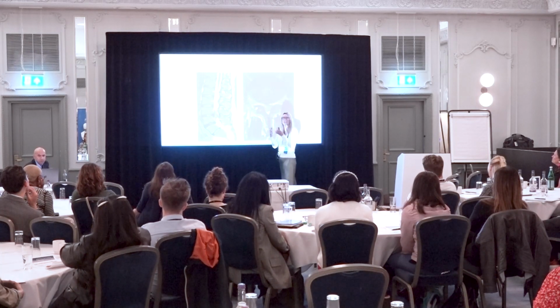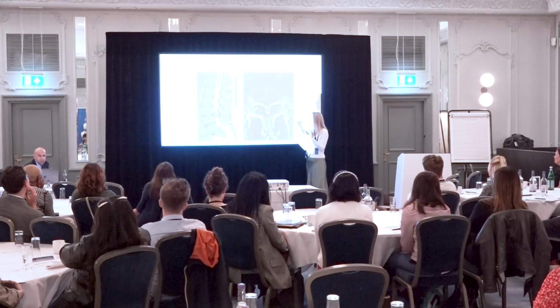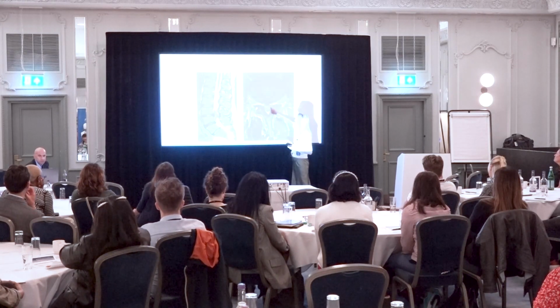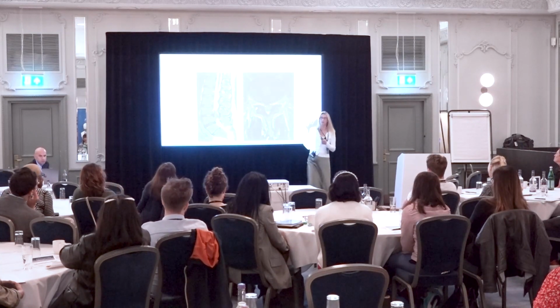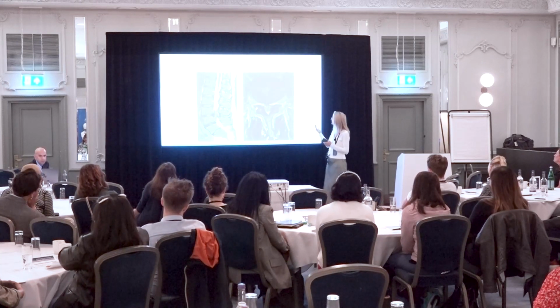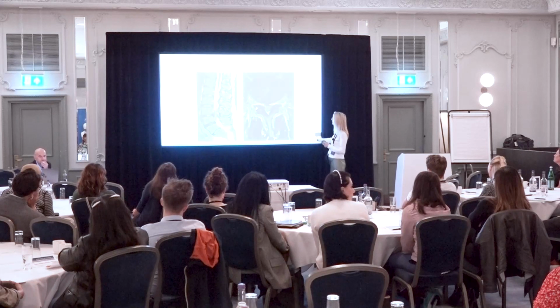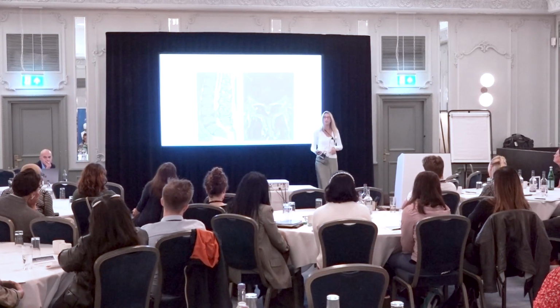So the canal is intrinsically a little bit narrow, and then when you get a big disc, patients are more vulnerable. When we do the axial view, you can see it can sometimes be quite difficult to tell where the disc is, but it's a very edematous acute disc, and so it's almost the same colour as CSF and fat. But you can see that this theca is markedly compressed, lost CSF signal, and they need urgent surgery.